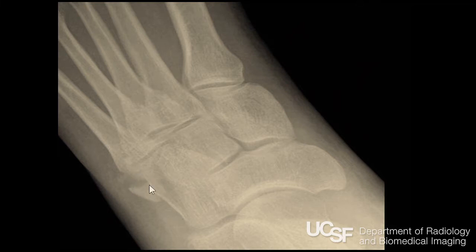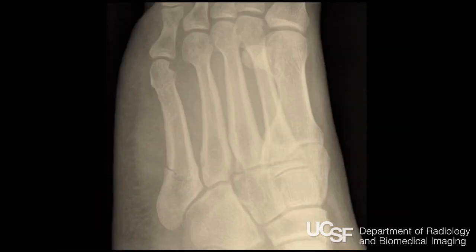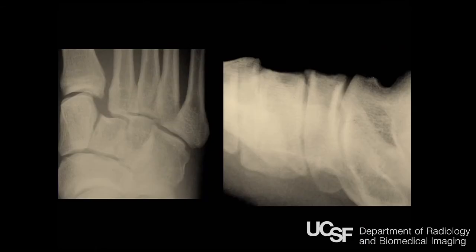This one is an avulsion of the apophysis, so it's the very proximal pole of the fifth metatarsal. This one, the person is allowed to walk on with a cast or a walking boot. This one is a Jones fracture. It occurs at the junction of the metaphysis with the diaphysis. This one, you're put on crutches. The reason is because you are more likely to go on to a non-union with this than you are with the avulsion injury. And then a fracture in the diaphysis may actually be treated with pins. So just describe the anatomy rather than use the cute names.